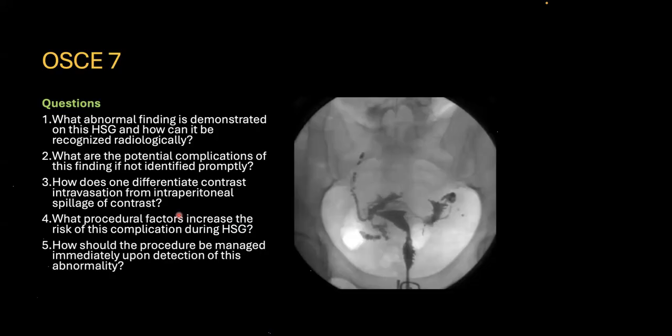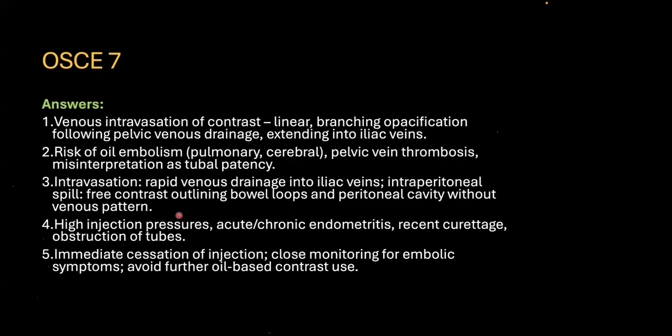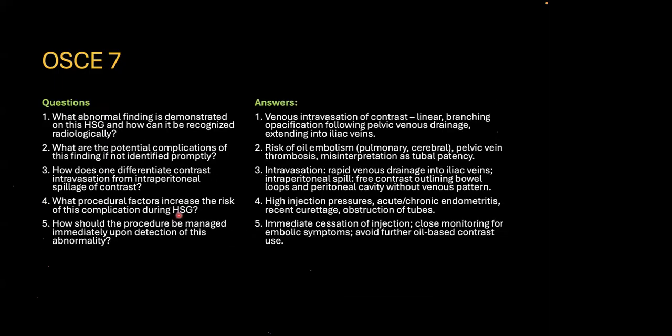Should we proceed for the answers? All right. Okay. So, what was the abnormal finding? There was venous intravasation of contrast, more so in the right iliac veins.